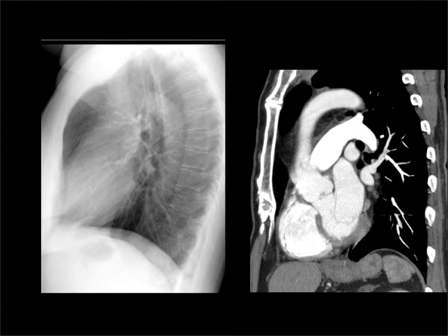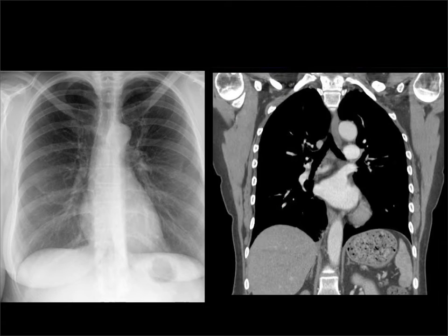Now, the important thing to notice in the front of the heart is that we have 3 bumps. We have the right ventricle, we have the pulmonary outflow tract, and then we have the ascending aorta. Right ventricle, pulmonary outflow tract, we're just a little bit off sagittal for that, and then the ascending aorta. Here's that left atrium. So as I said, you've got your carina, and the left atrium sitting under it. So as it enlarges, it will lever up that carina.